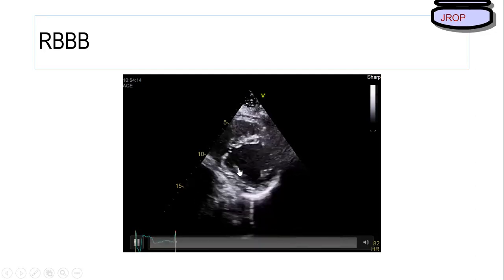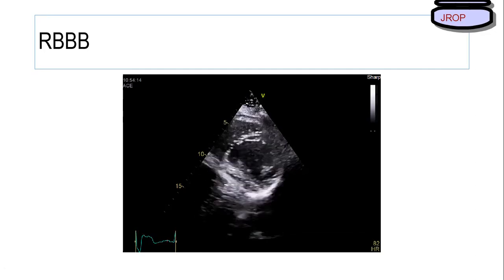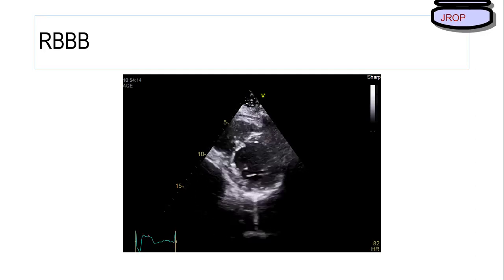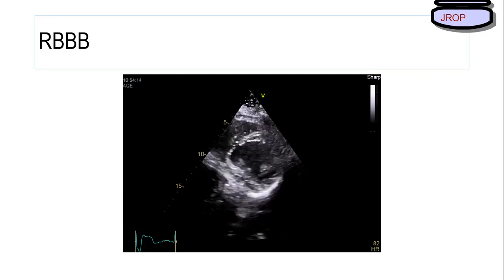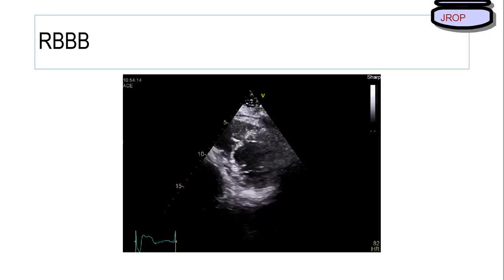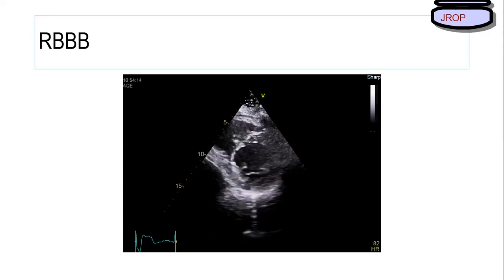So inferior wall has got a papillary muscle and lateral wall has got a papillary muscle. Where is the confusion? Sir, at this particular level, these are segments, so why are we saying that this is inferior wall? Wall is a major area. Your perception is perfect. We should say mid septum or mid lateral segment or mid lateral wall, not lateral wall. Correct, you are absolutely correct.